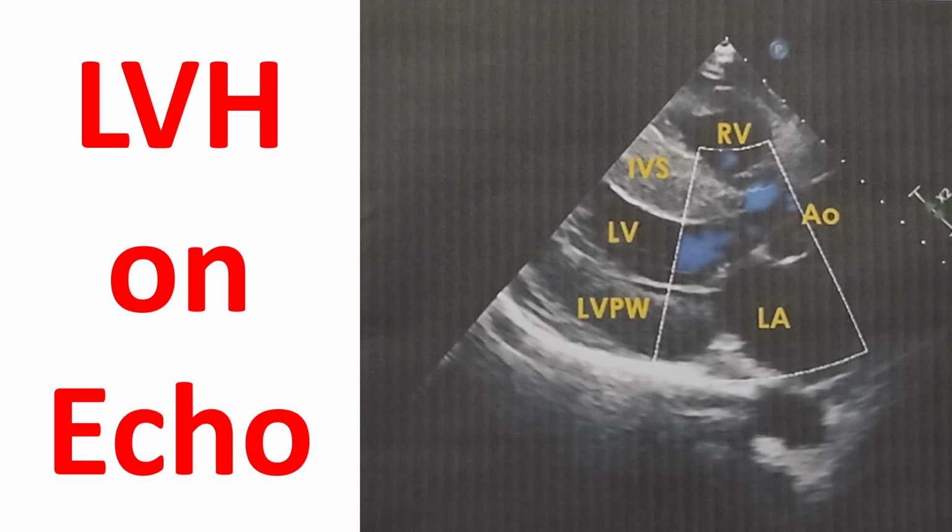Eccentric hypertrophy, where the wall is thickened but the cavity also gets dilated, can occur in chronic aortic regurgitation because of the volume overload. And a third variety is asymmetric septal hypertrophy. Septum is hypertrophied more than the posterior wall. That occurs in hypertrophic obstructive cardiomyopathy. In some variants of hypertrophic cardiomyopathy, there may not be asymmetric septal hypertrophy. Instead, there can be concentric left ventricular hypertrophy as well.